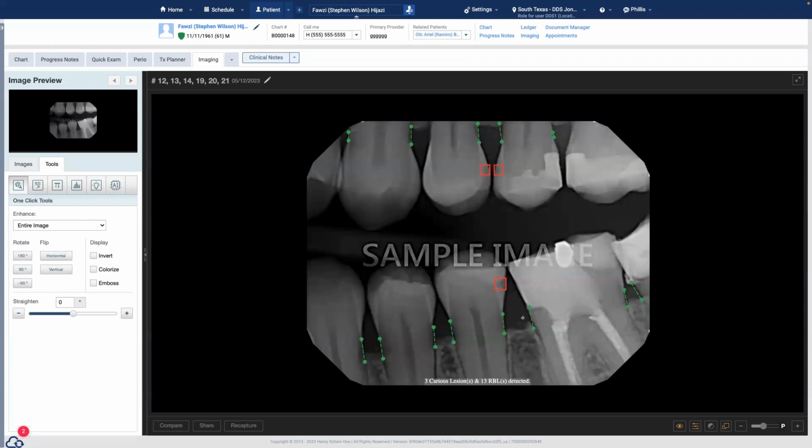Yeah, that would be great. I can tell you one of the things that I really like about the AI, and this is something people have to get used to, I think, is it's going to indicate on all the things you just said. That does not mean there are issues. That just means that it's trying to point you out to areas that you can, like you said before, doctor, look at and go, yeah, okay, that makes sense why it would do that, but I'm not going to do anything there. I'm going to watch that. This one, yeah, that one definitely looks like it's past a certain point. We need to come up with a plan to deal with it.